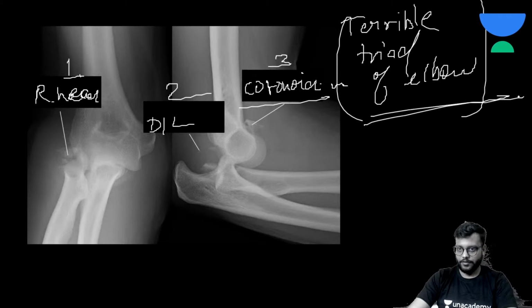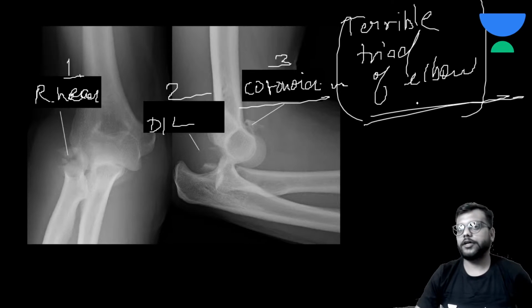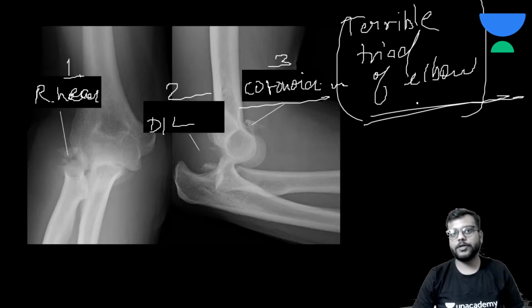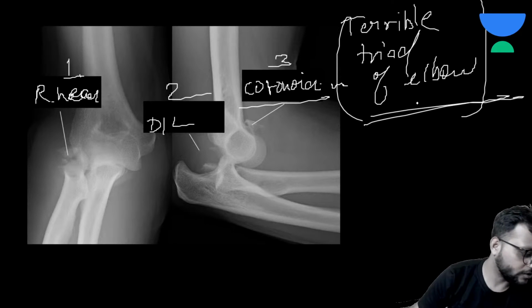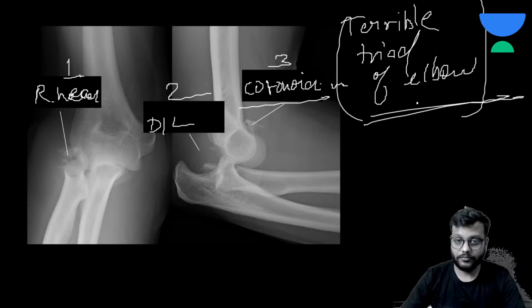Okay, and it is a highly unstable fracture, and firstly the elbow joint has to be relocated, and the fractures need to be fixed.